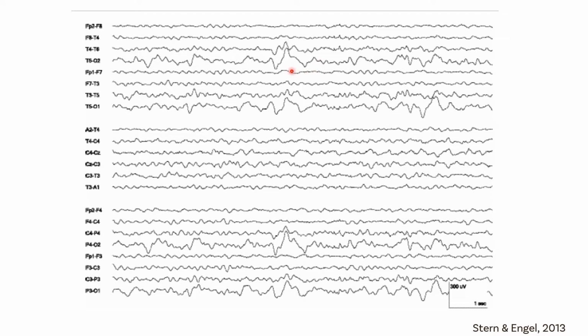It has a little bit of a shifting asymmetry. It's a little bit higher amplitude on the right when it occurs here. It's a little bit higher amplitude on the left when it occurs here. One thing we notice is that it really has that triangular morphology. So any guesses what this is? So the patient's asleep, so we know that this is not posterior slow waves of youth.